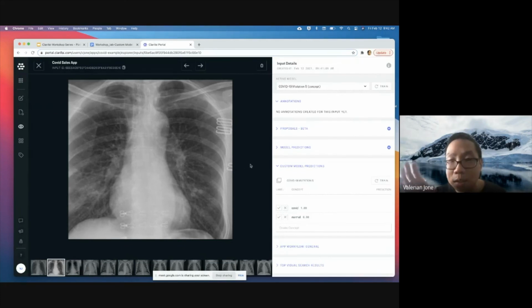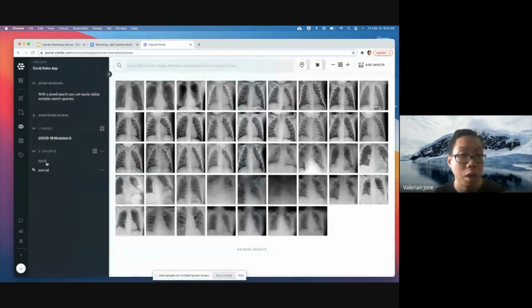So with that, that's how fast a model can be created from scratch, right? And when we talk about speed and agility, this is what we're talking about: being able to quickly evaluate the success of the model or the inaccuracy of the model even from that perspective. And then being able to quickly modify, do additional annotations, do additional labeling, tweaking the model quickly, and then hitting that train button right away so that you can, again, take advantage of the data as quickly as possible, right?